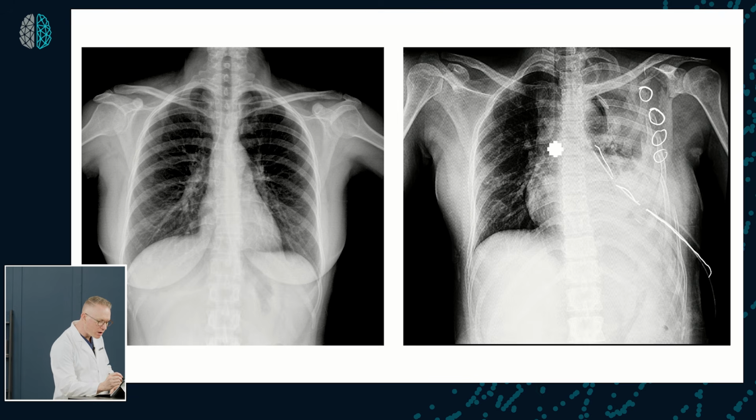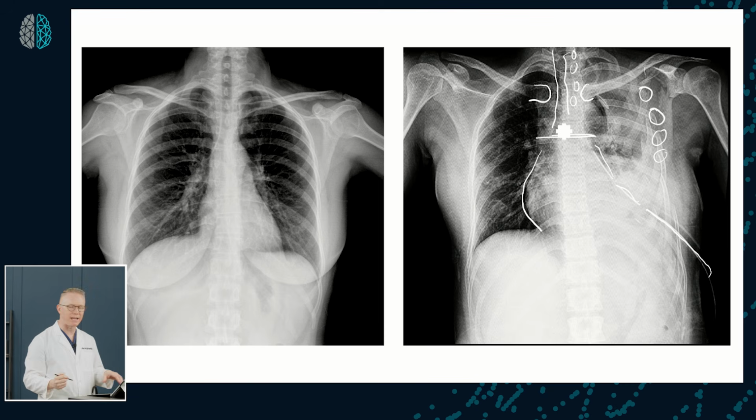Now look over here, you also see that the patient is not aligned correctly, and that makes the mediastinum look weird. It extends out the right side here, but if you look here, these are your thoracic spine, and here's your left clavicular head versus the other one over here. So the patient in this image is actually rotated.